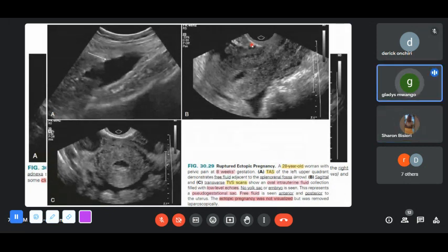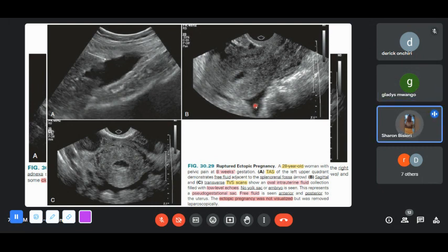To me, I don't know, it's a bit vague. This is free, it's not walled. So it's more of a specific. So it's anechoic, and it doesn't have echoes in it. Yes, because what you're seeing is artifacts from the ultrasound beam that are crossing. Those echoes that you're seeing, they're forming a ring. They're artifactual.